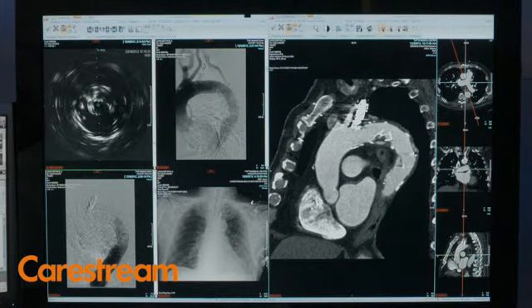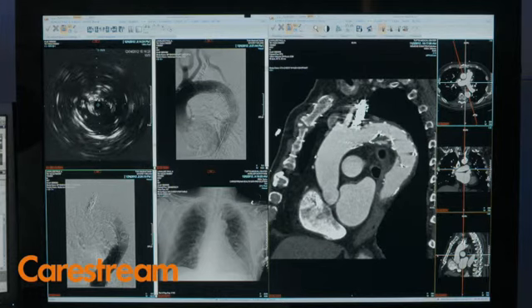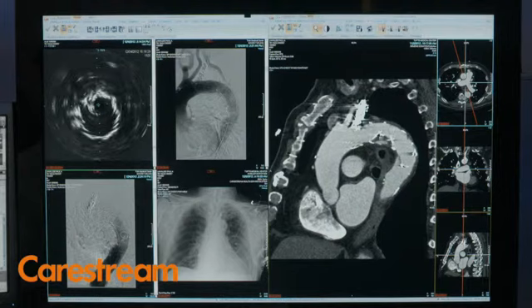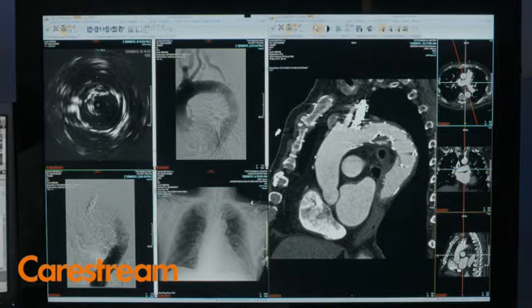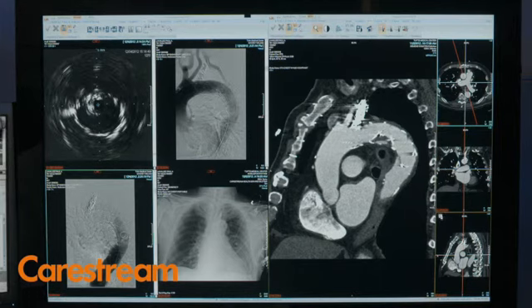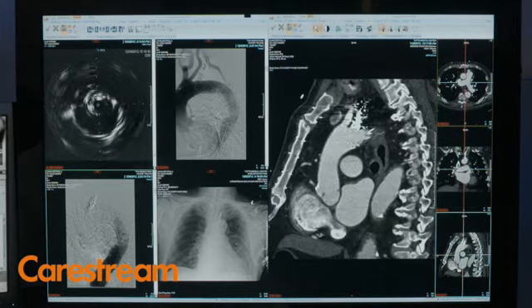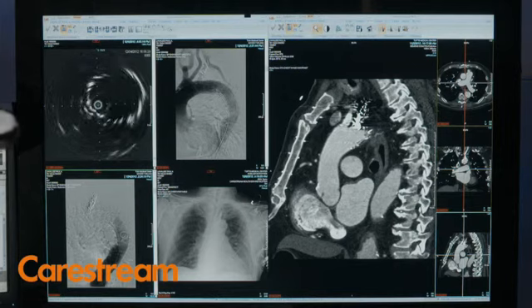So I can take this and I can create any angles that I need to create to look and see what's going on. We have an aortic arch here. We're looking at the endograft. We see some occlusion coils that were here. But say I wanted to look right here and see what this vessel looks like right here, I can take this, I can put another view over here right now, and then I can take this view window here and find the spot that I'm interested in.